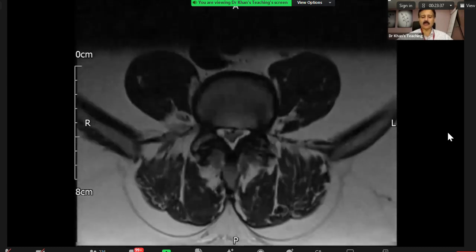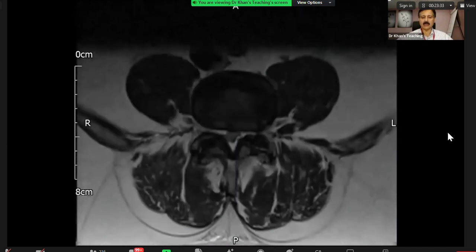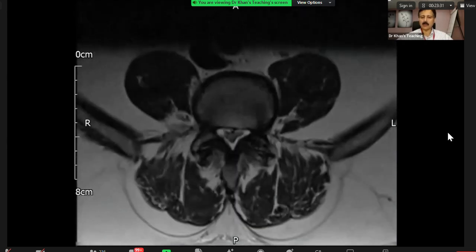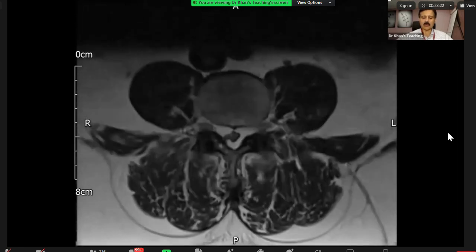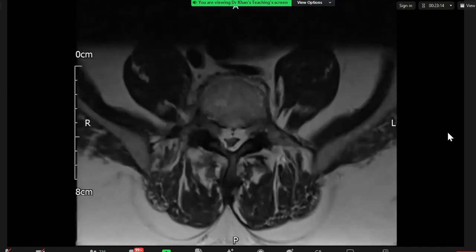So this is a potential long case. The bar in the 2B exam is going up and up. This case has not come in the exam, but it can come in the exam. Please remember, part of my endeavor was to show you, to develop your eyes, the different signals and things like that. That is why I have selected this case.